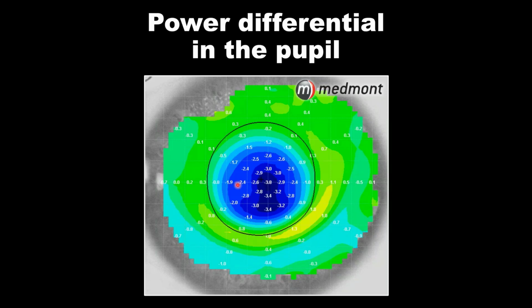If we head toward this meridian, we're at approximately 0.8 diopters of power. So there's a 3 diopter power shift from center to periphery. So of course, this analysis will depend on which direction you go. The goal, of course, being that pushing the maximum amount of plus in the pupil appears to be the way to do good myopia control.